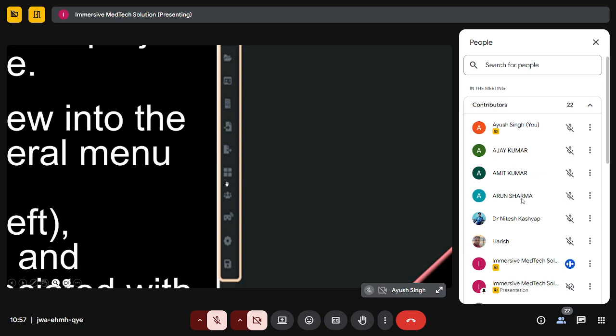Here we have the collaboration feature. So if we need to connect multiple users into a single virtual environment, that can be carried out from this particular menu option. Then we have a standalone XR connectivity. If we need to send only the particular file that can be directly opened in a VR headset, we can also send the particular file and directly open that in a VR headset using this standalone XR device collaboration.